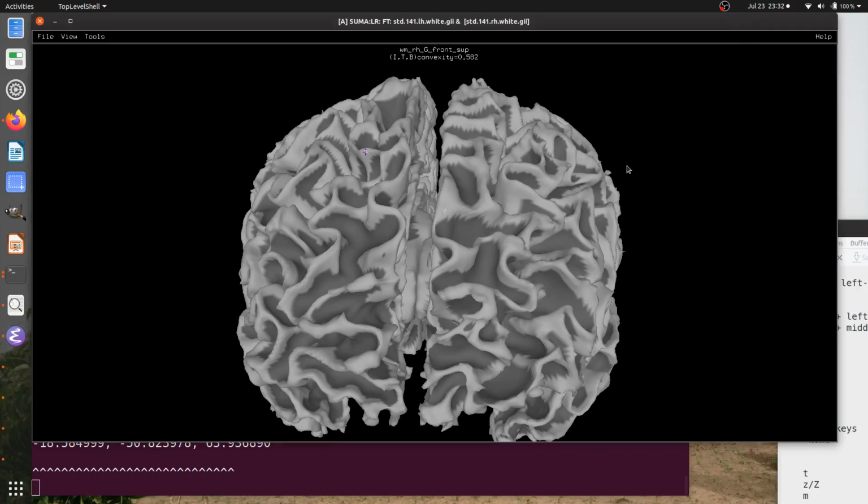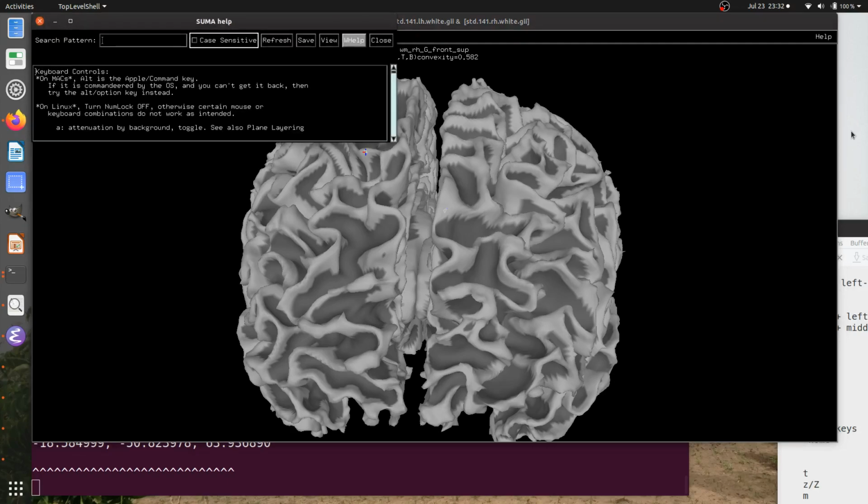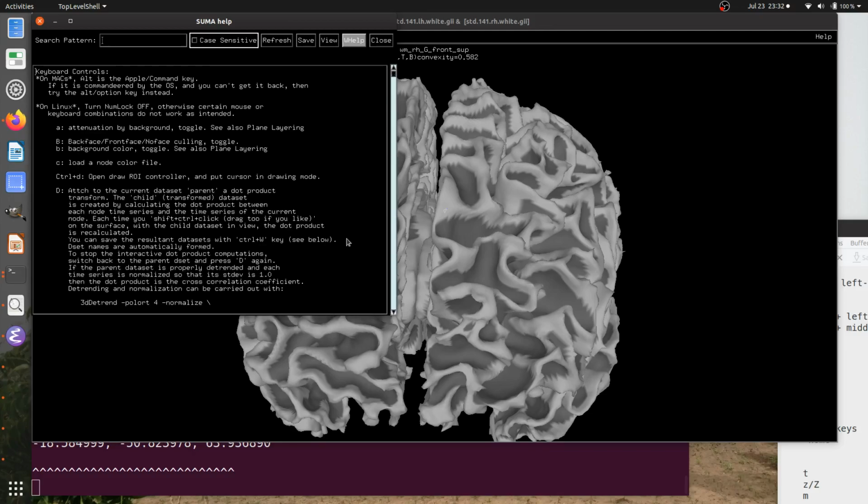Okay, right. Let's talk about opening the help. One thing to note is, as I do these key presses, if I have my mouse over here and I type Control H now, I'm surprised it actually worked. For most key presses, your mouse has to be over the window here. So now what we have is a help menu that's searchable.